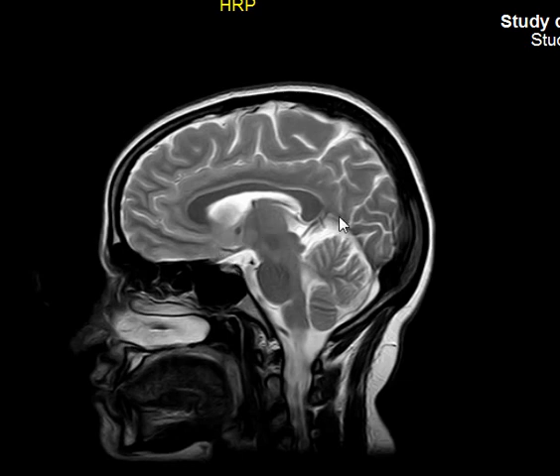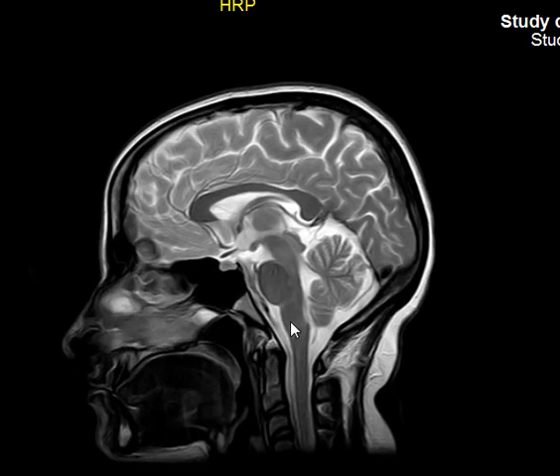The cerebrum is everything above the tentorium cerebelli and at the skull base. In the posterior fossa, you have the cerebellum posteriorly and the brainstem anteriorly. The brainstem consists of three parts, which are the medulla oblongata, pons, and midbrain. So, starting with the big going to the small, we have cerebrum, cerebellum, and brainstem. The brainstem contains the medulla, the pons, and the midbrain.